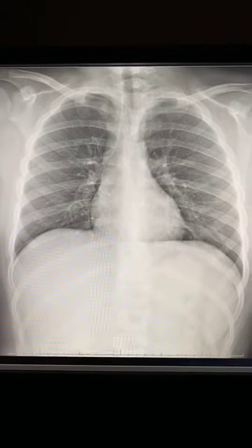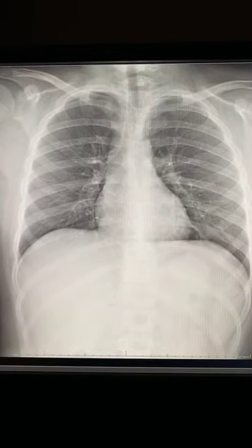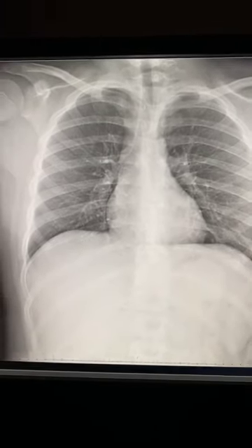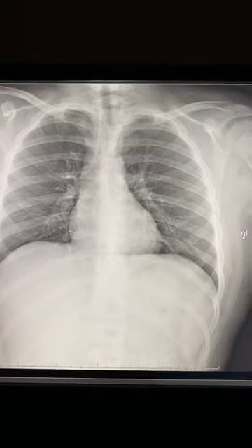You can get a head CT and it'll be toe pain. You can get an abdominal CT and it'll say brain hemorrhage. So the chest X-ray, if I'm looking at the indication, I'm not really banking too much on what the indication is, but it's probably short of breath, probably chest pain, something like that. So I open it up, I see this, all right?